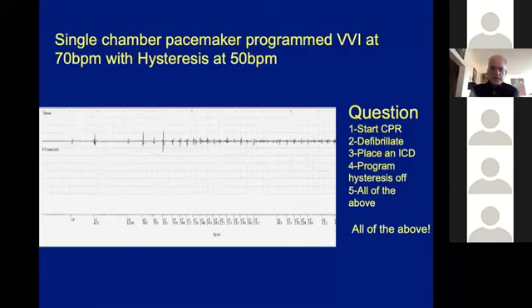Oh, and already, unfortunately, the answer is below. Well, you're right. I mean, the answer is already revealed below. So it's all of the above. Well, what happened here?